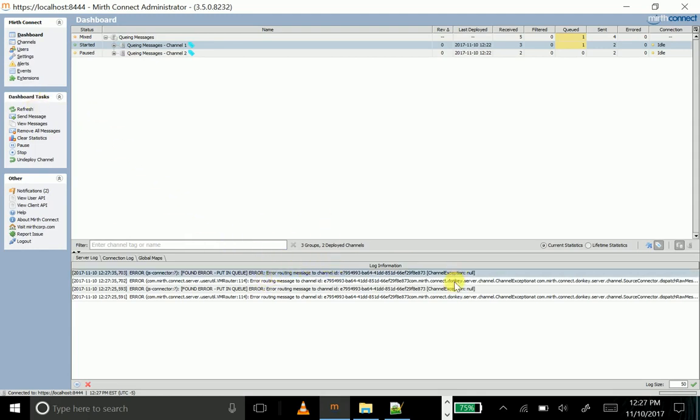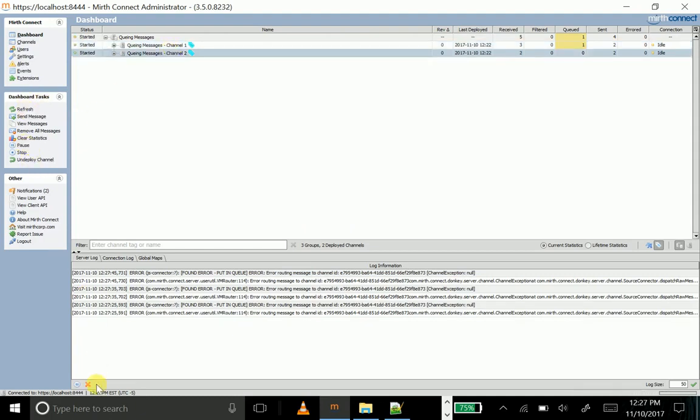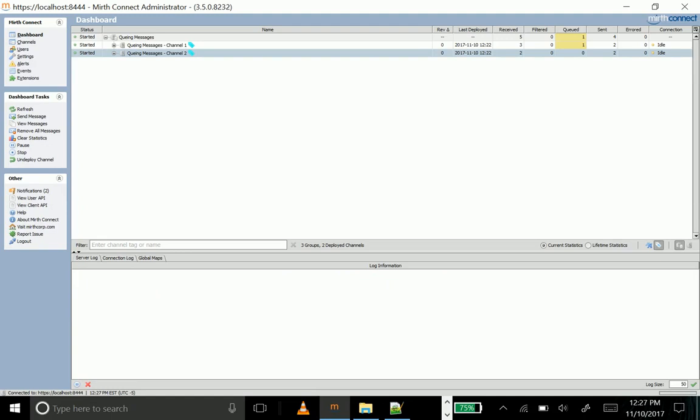This is the channel ID of number 2. Keeps going, keeps going. So let's start it. Make sure that those messages get out of the queue. Yep, there they are, out of the queue. And we have an error logger here, says no error. So that's how that goes.